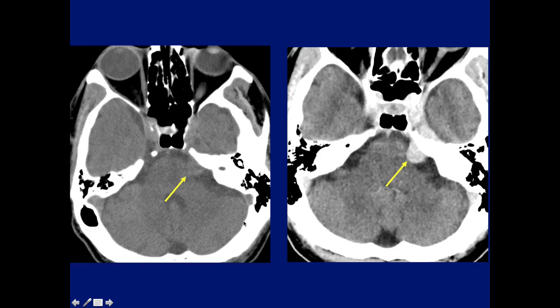And this is the last case I'm showing. Where's the abnormality here? Correct, as Eric says, the left cerebellopontine angle, we see a mass. Post-contrast on the CT.